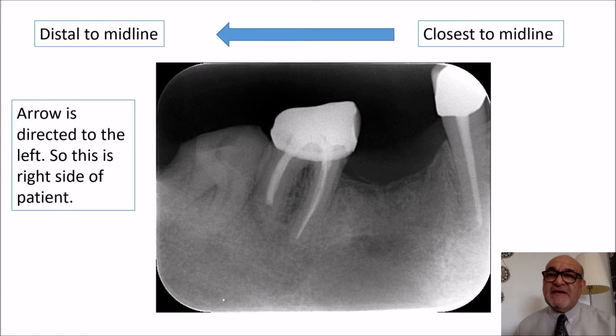Same, the mandible, 5, lost 6, 7, and 8. Now this area is again for the mandible, because you don't see here a maxillary sinus, and you don't see a mental foramen. If you see a maxillary sinus, or you see a zygomatic process of the maxilla, these are the questionable cases, by the way. Sometimes you don't know, is this the maxilla or the mandible? You look at the teeth.